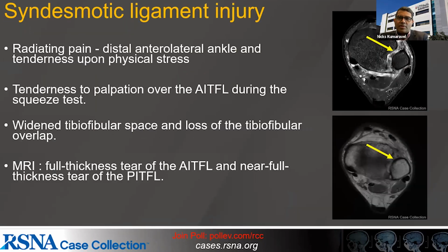And the components we're looking for is obviously marrying up the clinical findings first. You really want to think about where the pain's coming from, taking as much of the information as available to you. And if you're in my kind of practice, all you get is pain, but in this case, we give you more information than that.